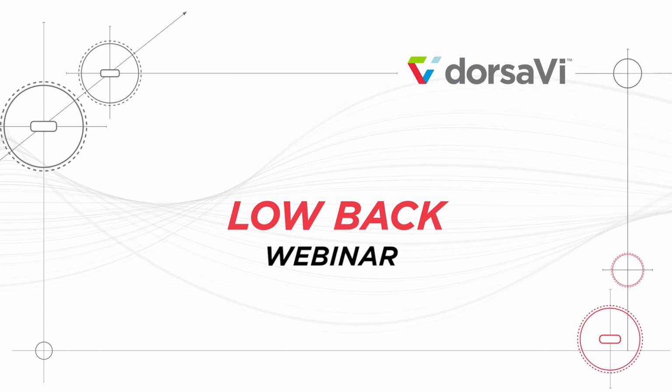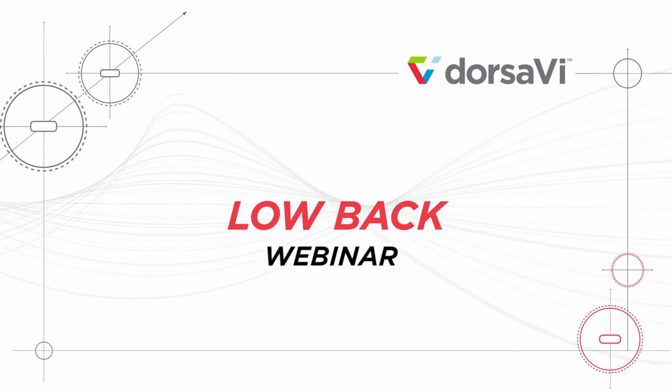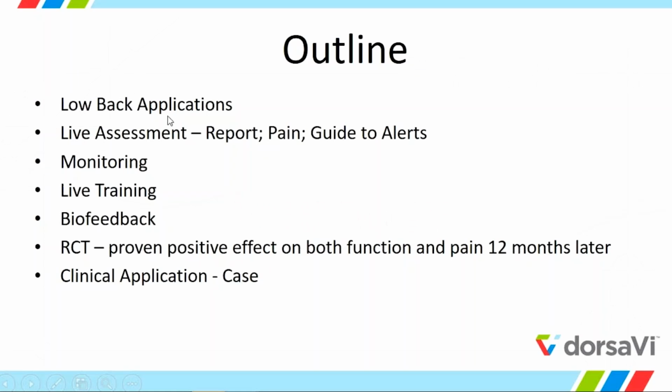Okay, so today we're going to talk about the low back assessment. Here's an outline of what we're going to do today. We're going to talk about low back applications, the live assessment, the report, adding pain, and a guide to alerts. We're going to talk about the low back monitoring session and how to use that and apply it clinically. We're also going to talk about live training, which is an excellent kind of neuromuscular re-education tool.